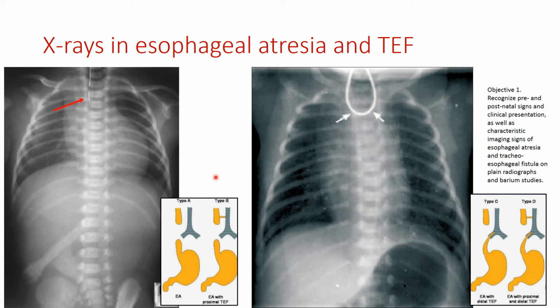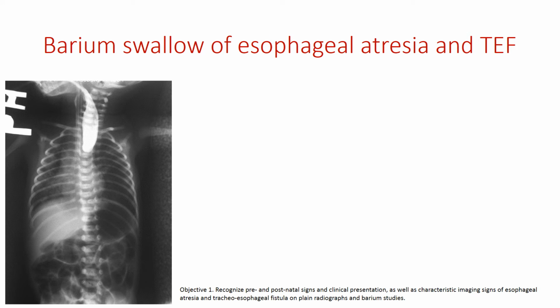Now, why doesn't the nasogastric tube go into the fistula? It's just because these fistulous tracts, again, are small. They're at an acute angle, but mainly they're small, and the nasogastric tube just won't fit through them. We try to avoid barium swallow on these patients.